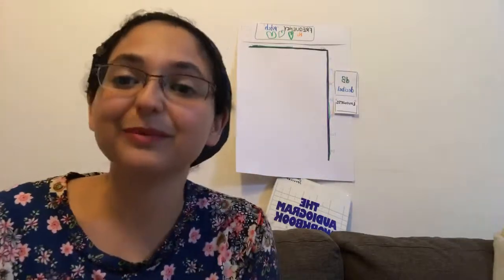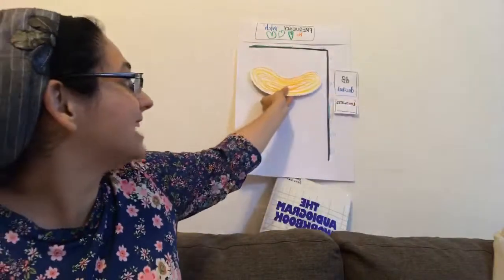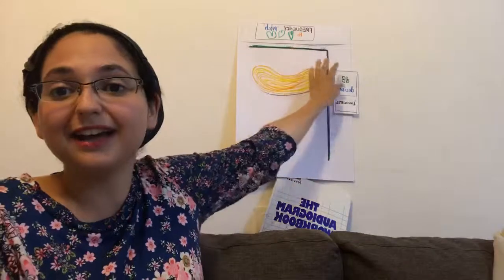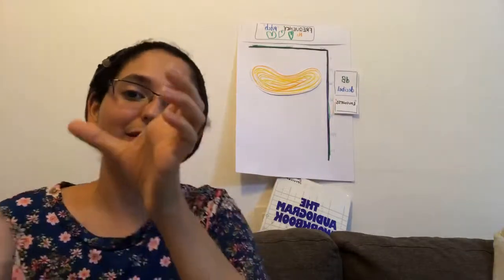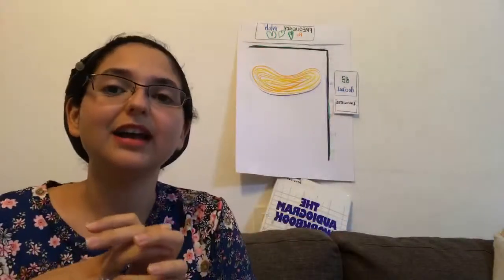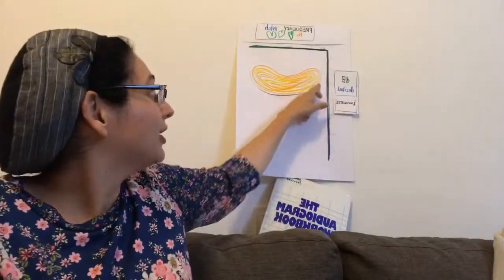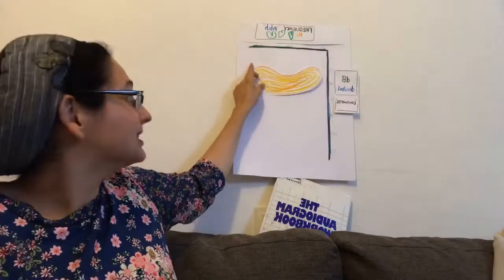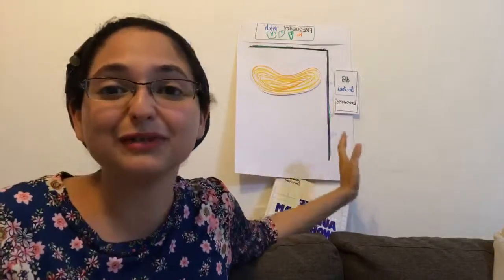So exactly what they're asking is, does the speech banana represent the normal sounds of speech? And that's exactly right. So the speech banana goes right around maybe 30 to 40 decibels, and because of the slope of it, it's showing that the sounds of speech are in the low frequency and the high frequency, and the mid frequencies are a little bit lower. But that's exactly right. That's where the sounds of speech are, and why it would be very helpful to have a speech banana overlaid on your audiogram.